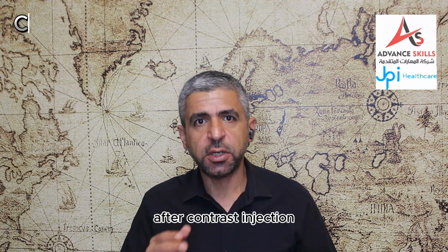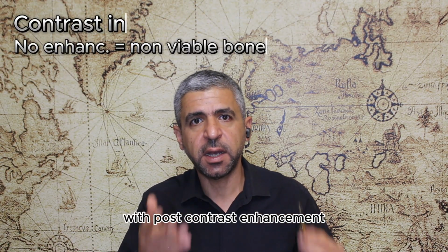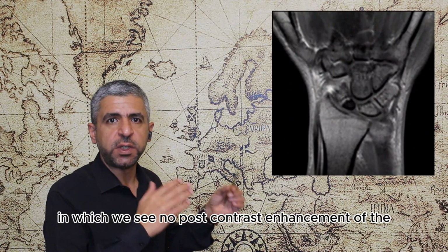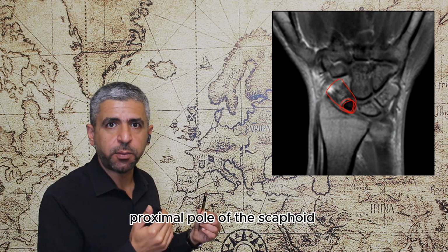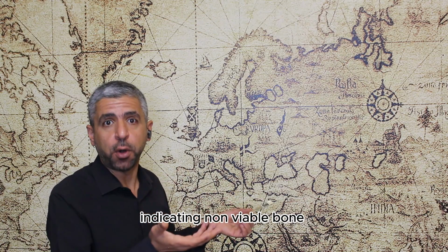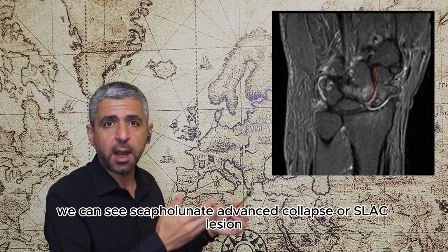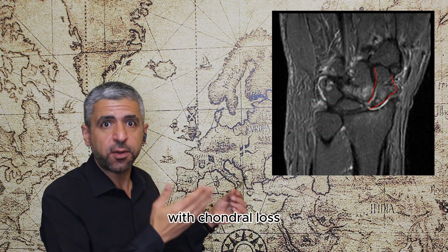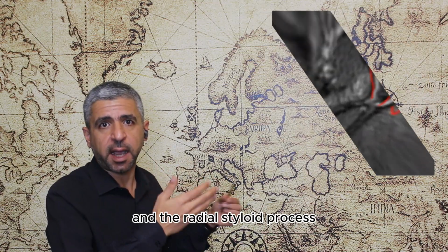After contrast injection, we can document the viability of the proximal pole with post-contrast enhancement. Like in this case, in which we see no post-contrast enhancement of the proximal pole of the scaphoid bone after contrast injection, indicating non-viable bone. Also in this case, we can see scapholunate advanced collapse or SLAC lesion with loss of contact between the distal pole of the scaphoid and the radial styloid process.